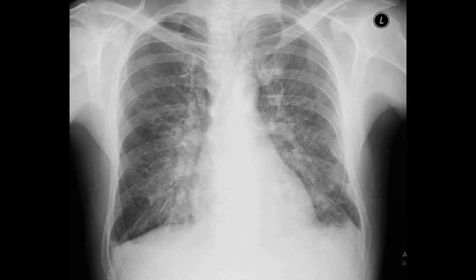So in this x-ray, it is a pathological one where we have pathology on both lung fields. First of all, also the heart silhouette. The heart silhouette should be half of the whole thorax diameter. It is called the cardiothoracic index. Here it looks like it is a little bigger than that. So the heart silhouette is enlarged. That is important, because maybe the patient is having heart problems and the heart is dilated, and the heart silhouette will then be larger.